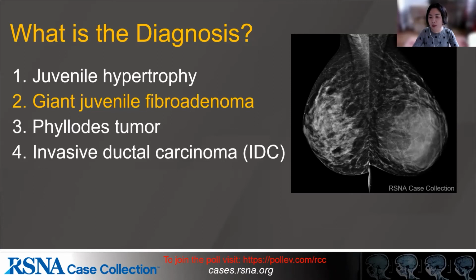Phyllodes tumor, as many people pointed out, radiologically and clinically can be indistinguishable from the imaging set that I just showed you. But this patient is only in her 20s, and the typical demographic that phyllodes tumor is seen in is much older, in their 40s or 50s typically.